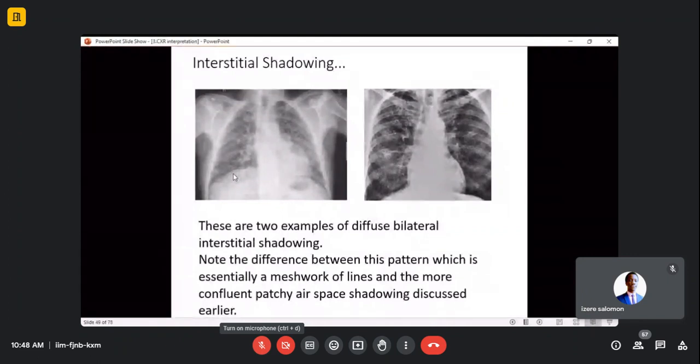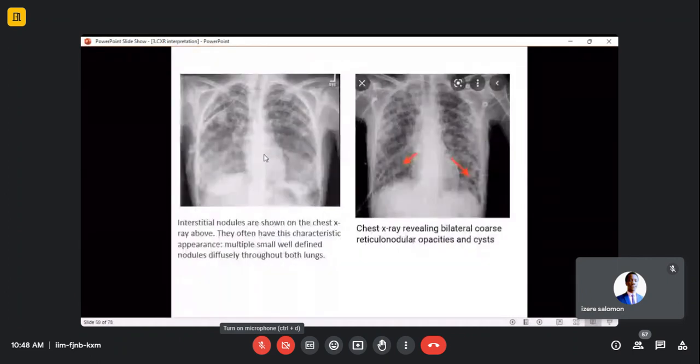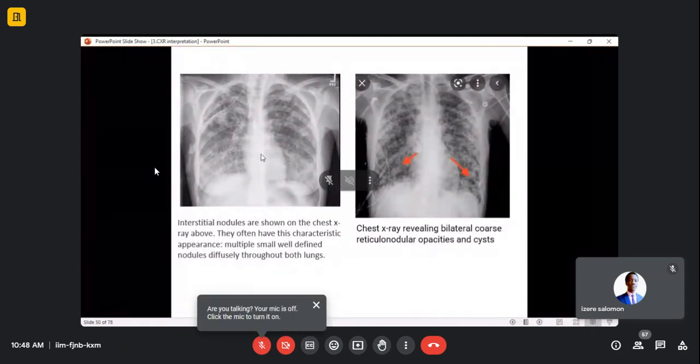I can see just this, typically, but I understand you. Maybe can you compare there and here on this? Are they the same?